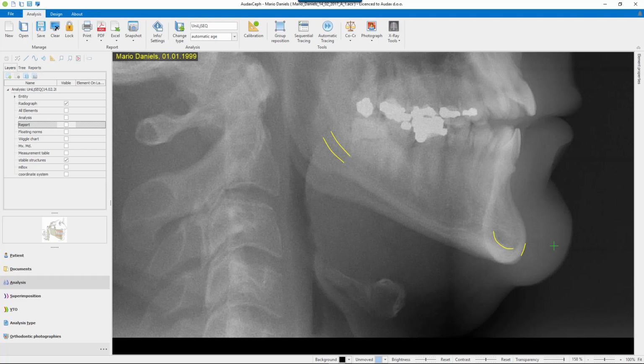There are the primary and the secondary structures which can be used as well. The primary ones are most important and use them whenever they can be visualized. Secondary structures are used to support primary structures or when the primary structures cannot be clearly seen. Perhaps the most reliable primary structure is the contour of the chin just below pogonion.